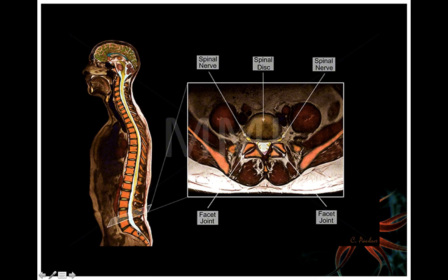Okay, and this is an axial cut. Axial view is simply looking at from the bottom to top. Remember, this picture is looking from side, and axial cut is looking from the bottom up. So this plane right here. And so if we cut through this particular disc, what do we get? This is a picture that we get.